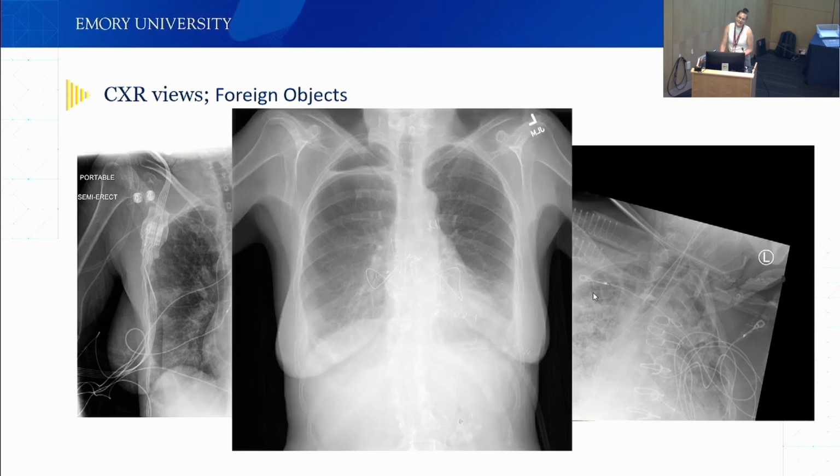I'm curious, I have to admit, I'm not a radiologist. I missed this one until one of the radiologists who did my labeling was like, Marleen, you want to remove this from your COVID database? Anybody see anything weird in this image? It's pretty subtle.